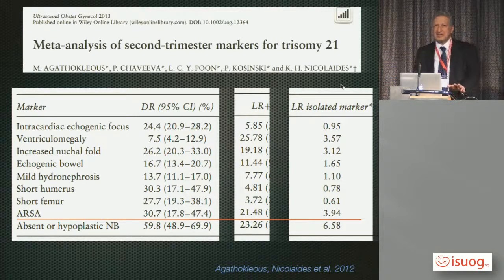You are not just saying, I see it's isolated. You should say there is no echogenic focus, there is no ventriculomegaly. And when you see that all are absent, and also this prefrontal edema and so on, you have an increased risk of 4 times, which is acceptable today, but you should be sure that this is mid-trimester.